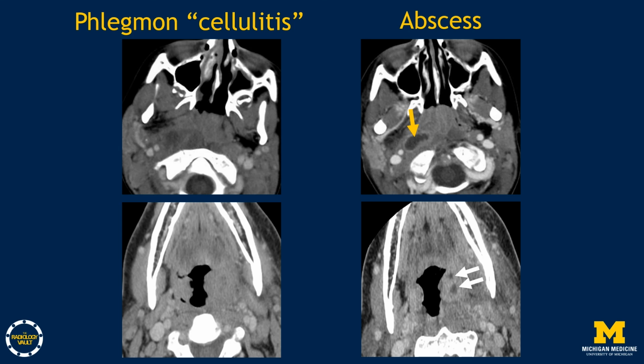Allowing these processes to mature will give them their full appearance, with the first patient having the retropharyngeal abscess as an area of hypodensity with well-defined margins, and the second patient has a peritonsillar abscess with areas of hypodensity deep to the enlarged left palatine tonsil.